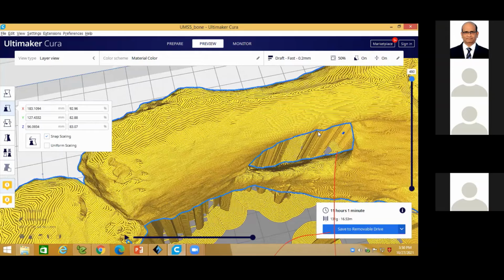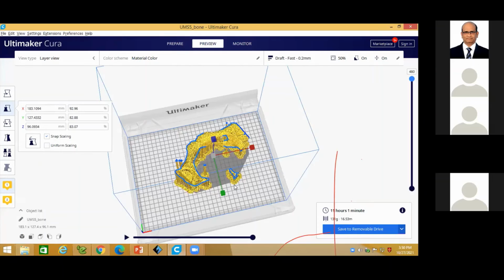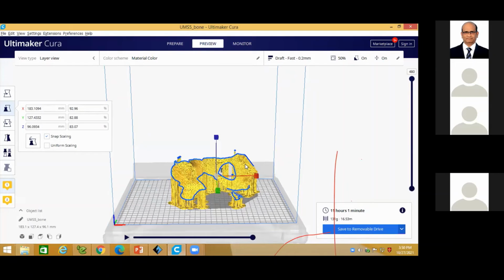Like that, we build a model in this 3D printing software. First we develop the STL file. That STL file you have to open in the CURA. Then you have to adjust the model on the build platform. Then set up the required parameters. Then go for the slicing. And here you have to choose the various orientations based on the time and the material. Different objects made of different materials have their own orientation to reduce the material and the time.